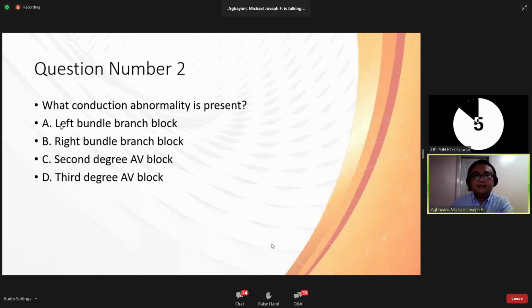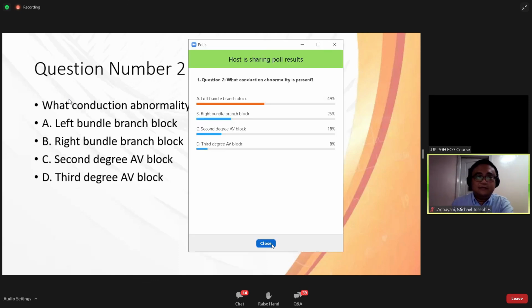Few more seconds. Okay, let's see the answers. The majority, although less than half of you, 49%, answered left bundle branch block.